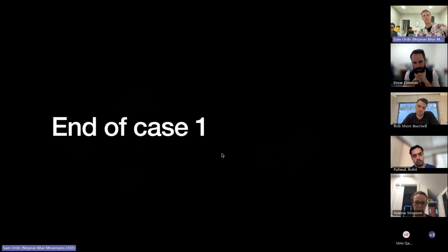So I'll take that. I thought that was excellent. The only thing that's missing is, so beautiful, no pauses or no errors in what walls you're looking at. That's absolutely what that case is all about. To be honest, if you're saying it's akinetic or dyskinetic, I think that would be cherry on the cake. So I thought they were akinetic rather than hypokinetic. Clear pass. But it wouldn't be a pass well because you didn't tell me about the chronic versus acute. That's where the prompt would probably come in, which might be the thing that would have knocked you back a little bit.